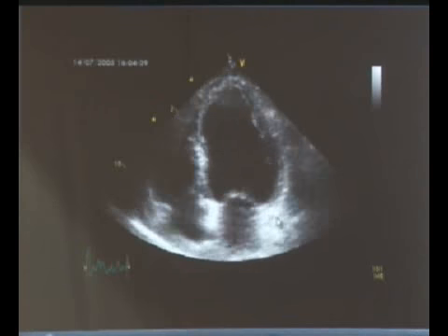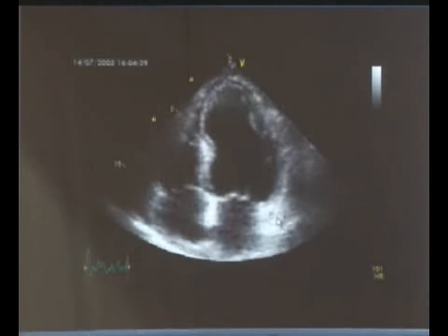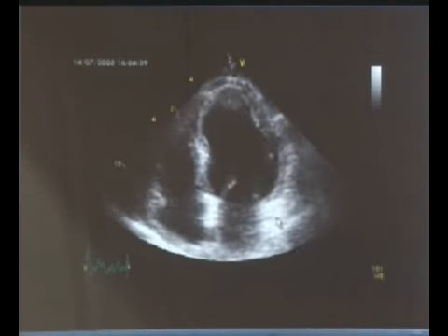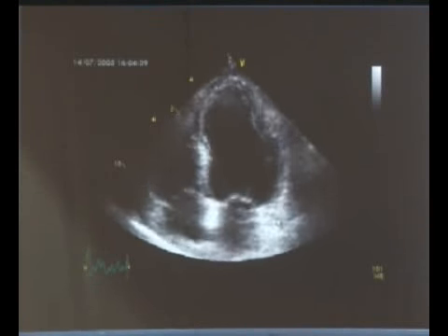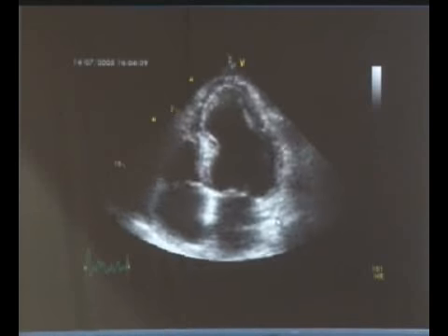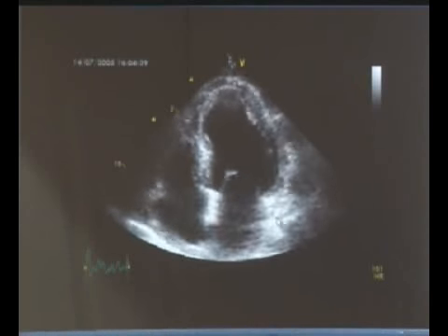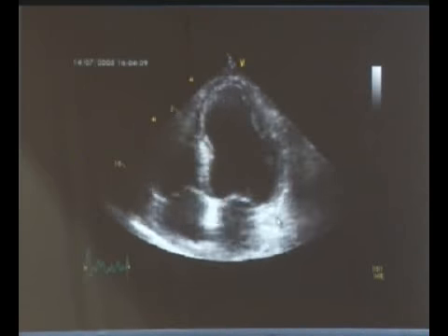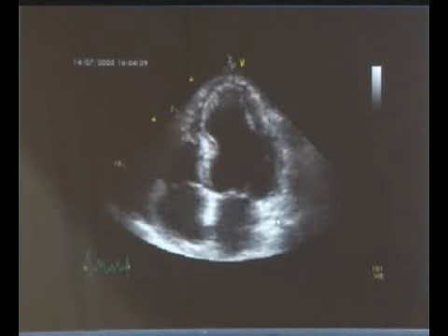And once you go back, never look only at the 4 chamber view to say that the patient's ejection fraction is this much and wall motion abnormality corresponds to LAD, RCA and circumflex. You have to see all three views before you make a wall thickening abnormality diagnosis.